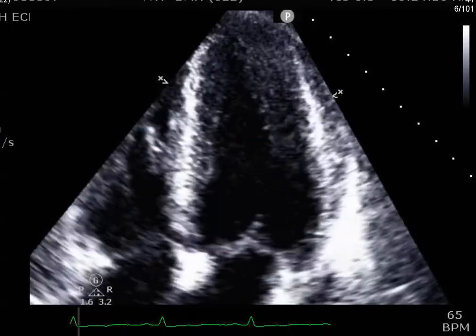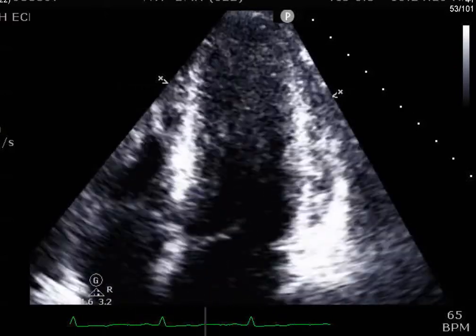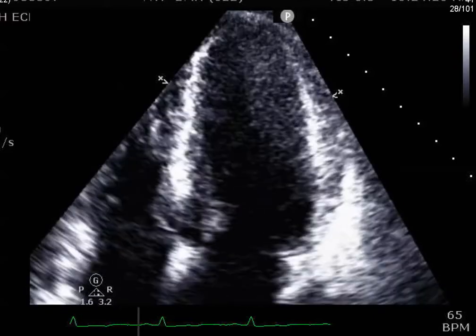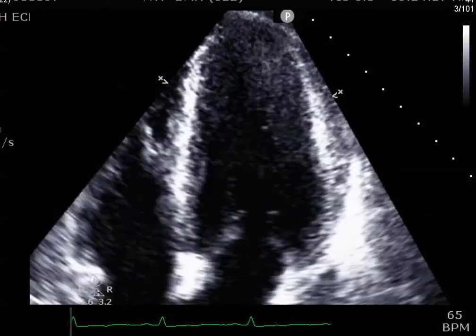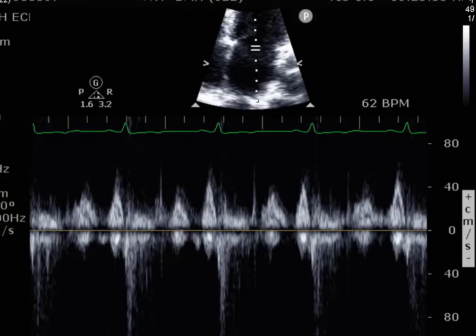When I see a picture like this, I mean, this is a pretty good picture, but I would like to see a DEFINITY opacification just to really hone in on the diagnosis. It would have been really helpful to me in this case, however, it was not done, which is okay. I think we have good enough pictures here, but there has been a good amount of cases where a patient may or may not have hypertrophic cardiomyopathy, that the walls weren't very clearly seen. So if you're suspecting it, always do DEFINITY. It really makes the diagnosis much more concrete and clear.